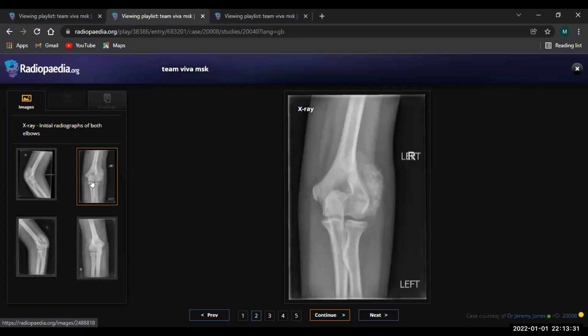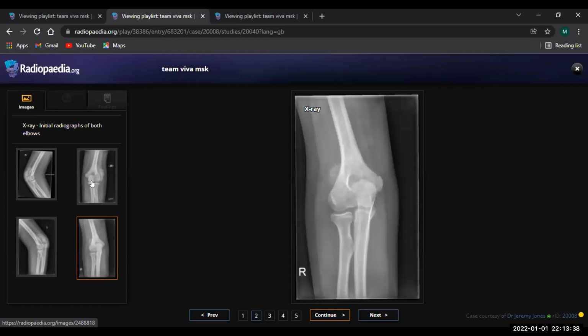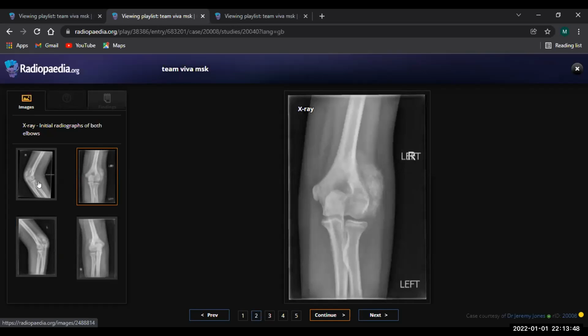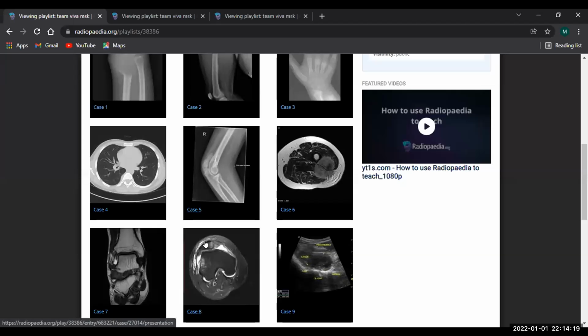Okay, and this is only posterior, and I'm thinking maybe it's a bursal problem or soft tissue calcification. Could also be myositis, but it needs to have trauma in this location. So differentials include osteochondromatosis or tumoral calcinosis or myositis ossificans. I'll compare with previous images if available and correlate with that.